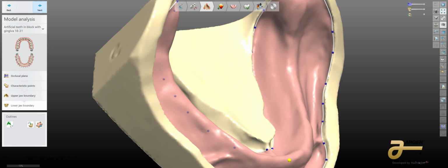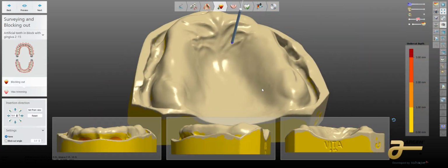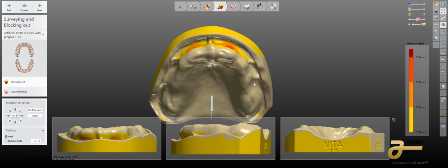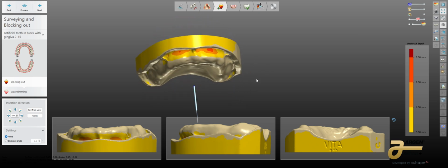All right, so we're going to do a one and done style aspect. I'm going to be able to talk over this and just share a little bit. If I make a mistake or I stumble or if I say the wrong thing, just recognize I'm not editing this. This is straightforward. So now we got to set our block out or our path of insertion for this case.